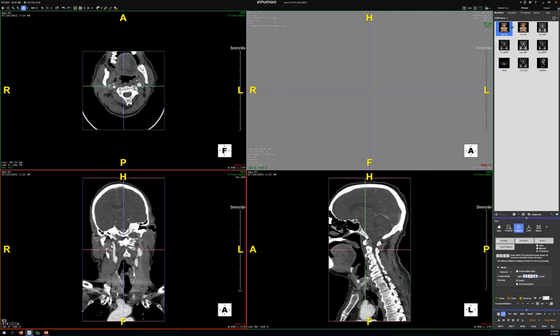That's fine. Do you remember the name of the foramen it's going into? I don't. Why don't you pause it and we'll look it up. Remember, I'm a cardiac radiologist. Hover over here and then hit pause. Okay. Carotid foramen. Many textbooks just say the external opening of the carotid canal, but carotid foramen's good enough. So let's start segmenting there.